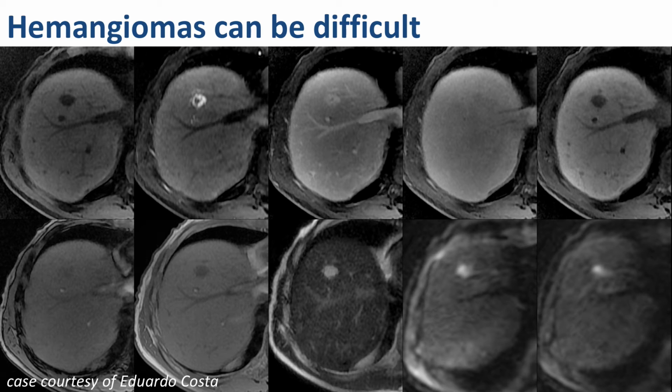This is a hemangioma. And you need to know that in cirrhosis, hemangiomas can become sclerosed. And when they become sclerosed, they shrink down. And the puddles of enhancement coalesce together, so they look like they have arterial phase rim enhancement. And the clue is that in the portal venous phase, this is still sort of holding on to contrast. And notice that it kind of filled in from outside to in. And also notice how sharply defined it is on the T2 single shot.